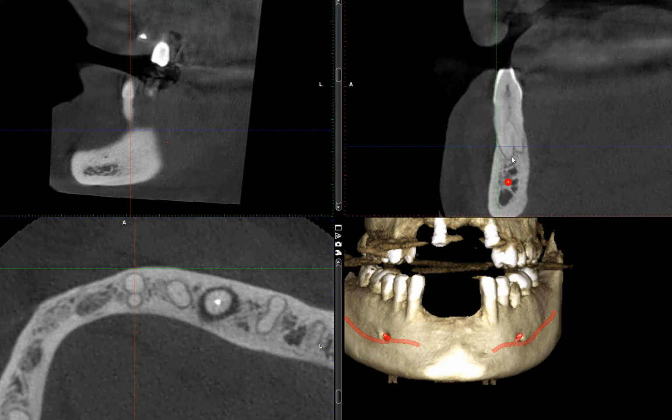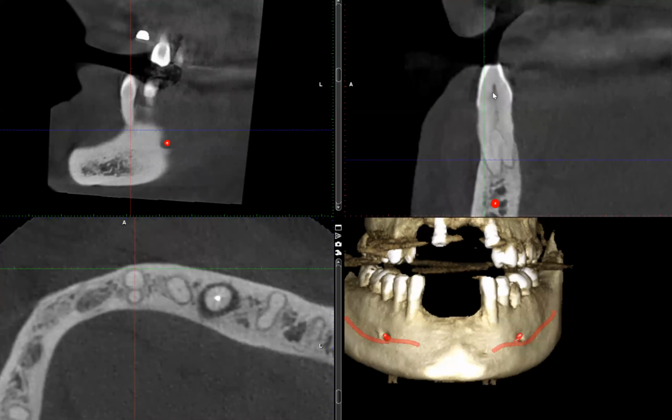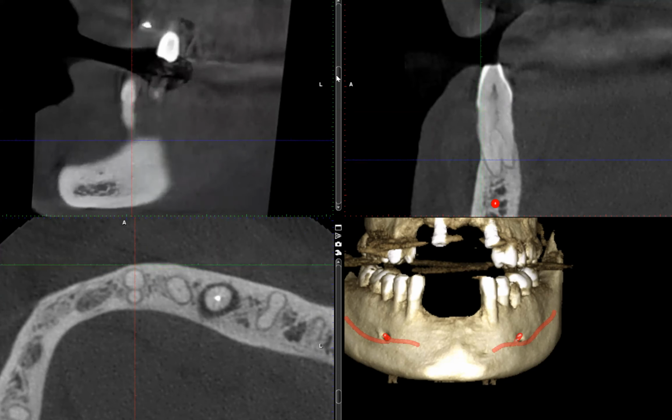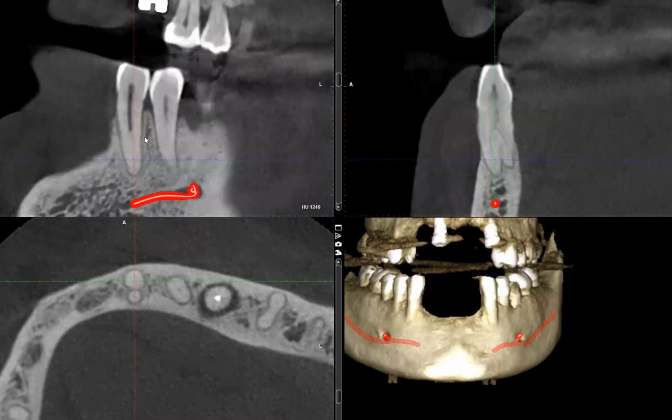All right, so now let's go ahead and focus on this canine again. So this is the canine. You can see the main branch, the pulpal space bifurcating again into buccal and lingual with two roots. And how would that look from the facial view? Here is where the bifurcation occurs.